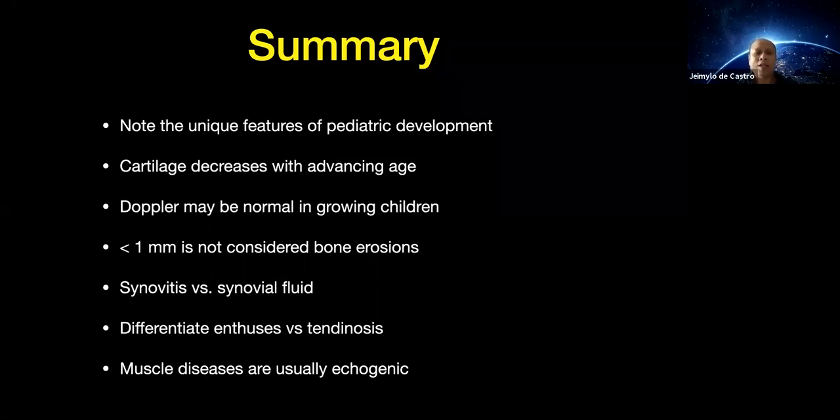And we need to understand the difference between synovitis, synovial fluid, and of course, synovial hypertrophy, also to differentiate enthesis versus enthesitis versus tendinosis. Muscle diseases are usually echogenic.